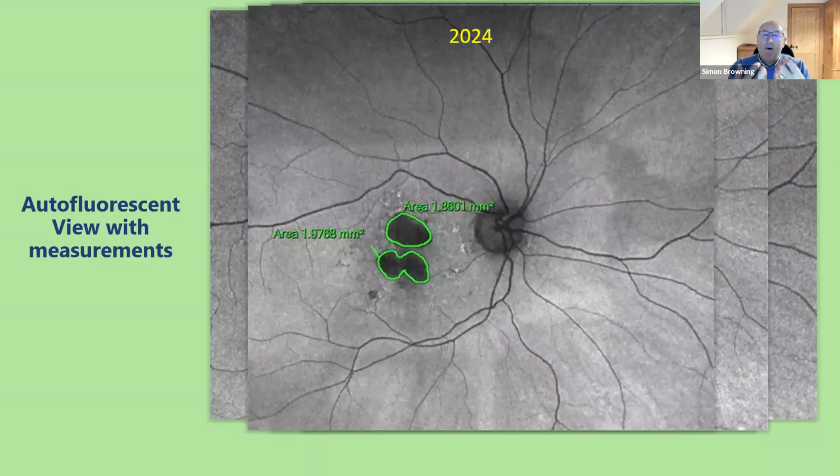So you can see how over time you've got this progression, and these are great images to use with patients in terms of trying to educate them to understand what's happening with their vision, but at the same time talking to them about what they can do in terms of their lifestyle approach to try and improve the metabolic environment, to try and slow this down, lessen this from happening. You can't guarantee by changing somebody's habits that they're going to get better or that they're going to slow down, but you're giving them every possible opportunity to do that.